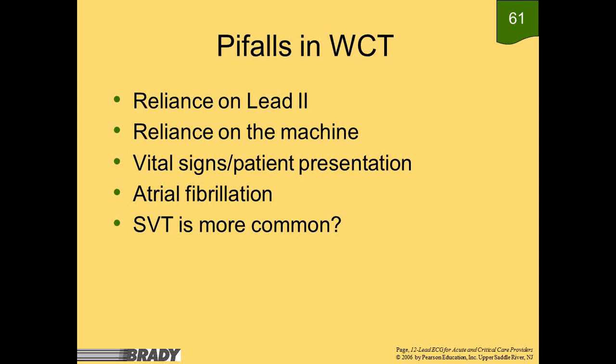We also need to think about atrial fibrillation and how that can present sometimes and look similar to a wide complex tachycardia. And then we need to look at SVT. When is it more common?